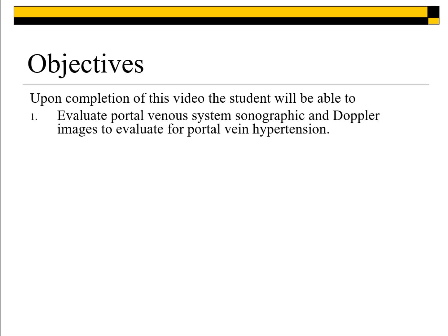On the completion of this short video, you should be able to evaluate the portal venous system sonographically and with Doppler images to evaluate and help diagnose portal vein hypertension. We'll discuss some of the pathophysiology behind it and some of the most common portosystemic shunts that we will see in the presence of severe portal hypertension.